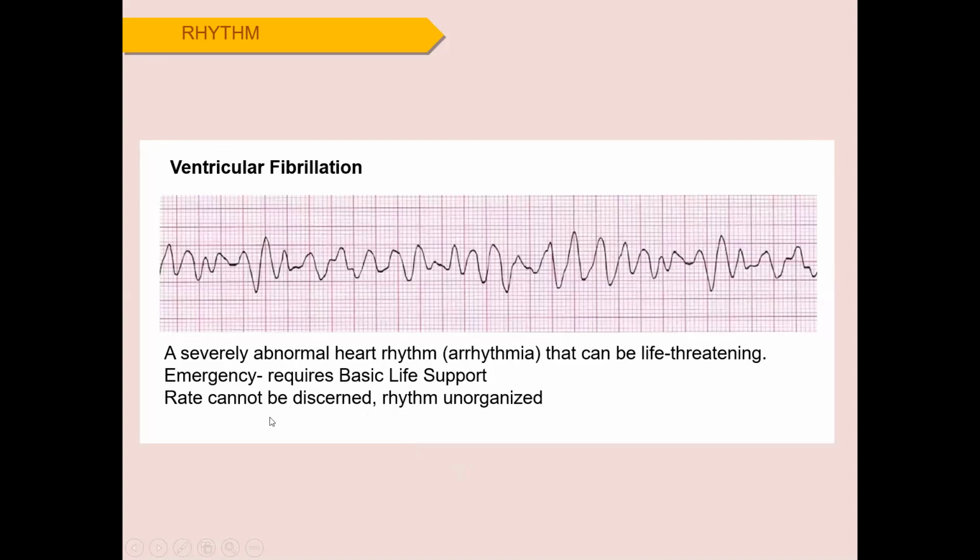Ventricular fibrillation, you can easily understand, is a basic life-threatening fibrillation, a severely abnormal heart rhythm, where you cannot recognize any particular rhythm. Look at the ECG. The ECG is not recognizable. No definite pattern is followed. So it is known as ventricular fibrillation.